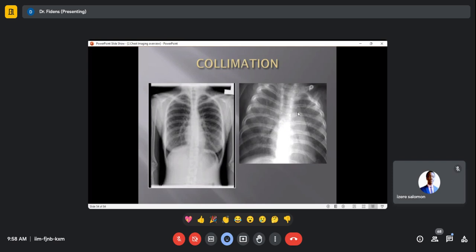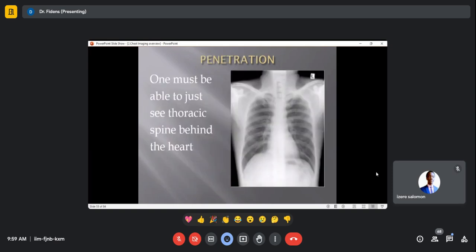These are two X-rays. Especially this one should normally be repeated. And by repeating, remember what happens: you are irradiating the patient again. So you should make sure that we don't make this kind of mistake. Okay? Do you get the message here? Yes, we do. Okay.